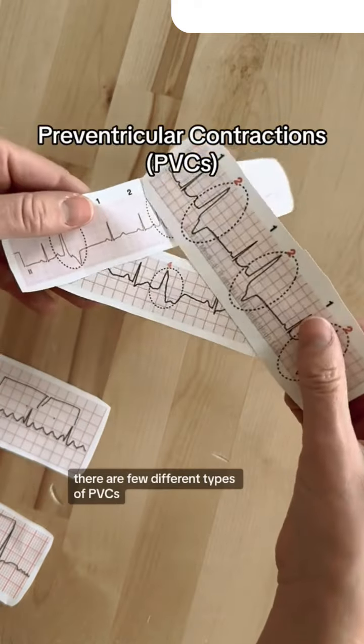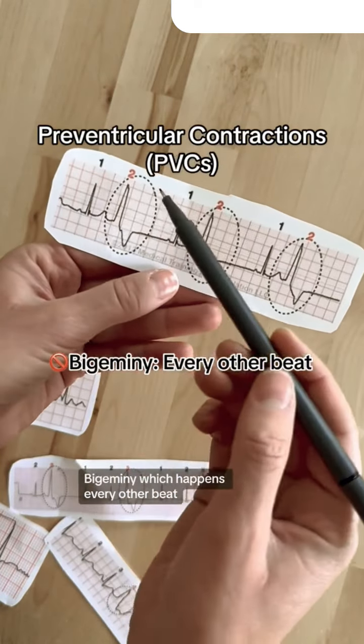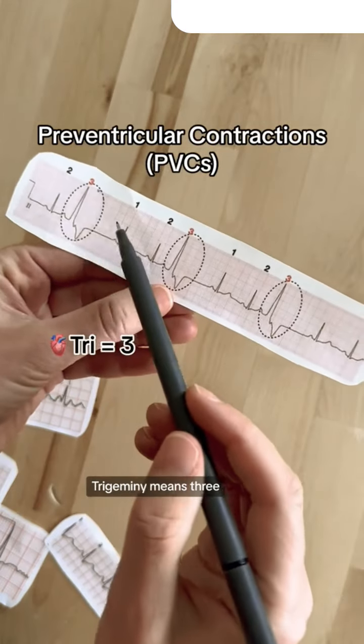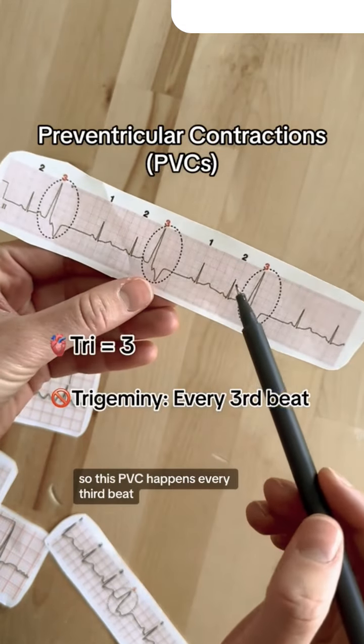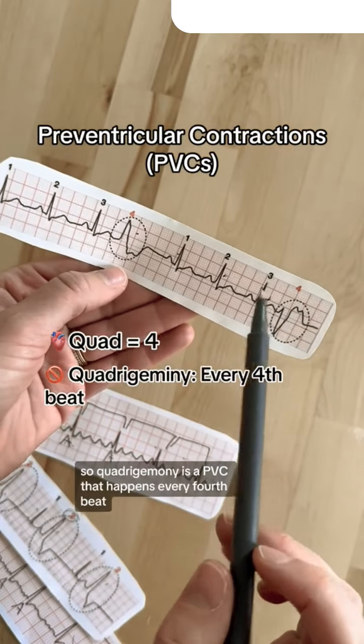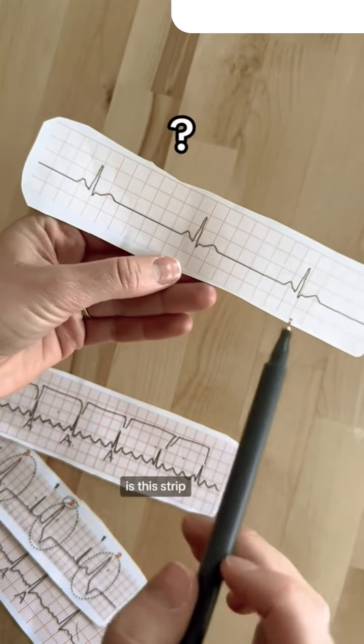It's important to note there are a few different types of PVCs. Bigeminy, which happens every other beat. Remember, bi means 2. Trigeminy means 3, so this PVC happens every third beat. Quad means 4, so quadrigeminy is a PVC that happens every fourth beat. Okay, last but not least is this strip.